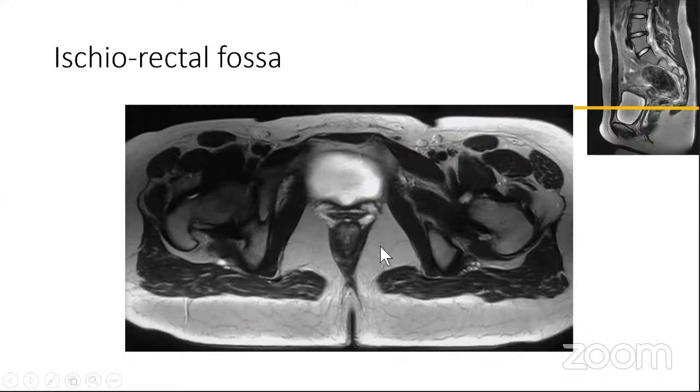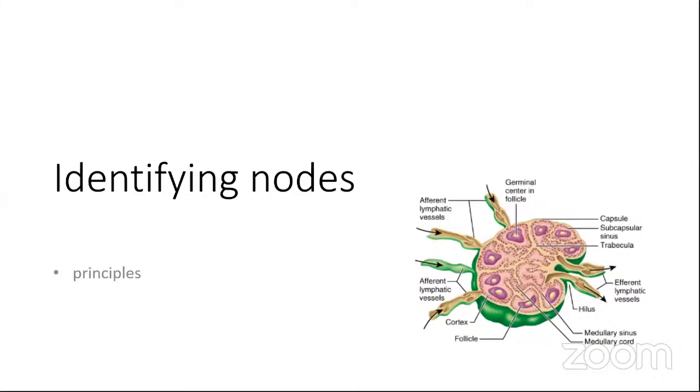So that indicates a very large tumor and a highly advanced disease, the outcome of which will be very, very dismal. Of course, we don't get to see many patients developing extension into the ischiorectal fossa. It's more common with rectal cancers than with cervical cancer. Just to give you an idea about what we need to see in MRI scans.